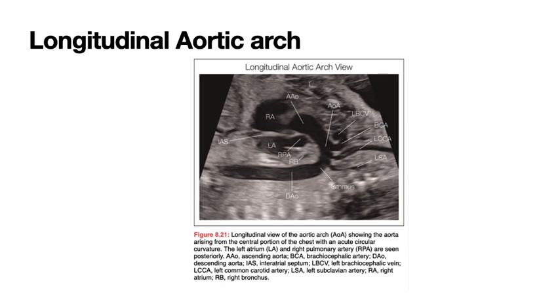And then, right after the left subclavian artery, it's slightly narrowed into this area called an isthmus. So just get familiar with what a normal isthmus looks like. It is a narrowing, but it's only a little teeny weeny bit. And it's important because that is the number one spot of where a coarctation would be. So an abnormal narrowing is exactly where the normal narrowing is.